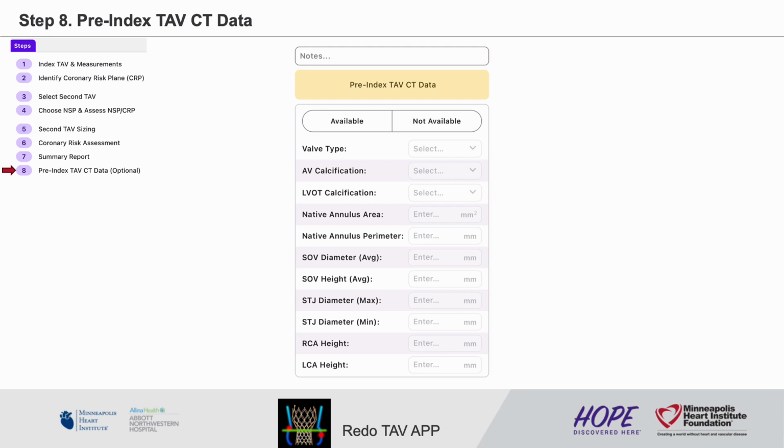These are all the steps we need to do for pre-procedure planning. I hope this video helped you in planning the Redo TAV therapy. Thank you.